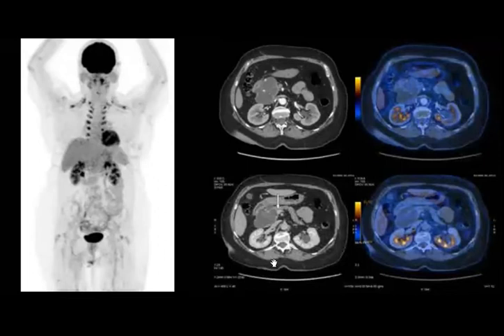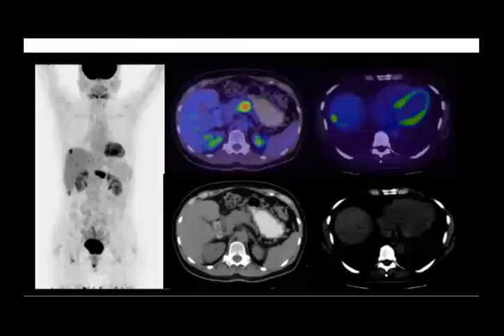Okay? Is it a nice case? Is it easy? Clear? Okay. Let's have a look at this. We have 1 minute before we finish. I hope that we can finish this case at the end of the session. If you have any suggestion, like every time, any feedback or evaluation, please send me. I will be happy to know your feedback.